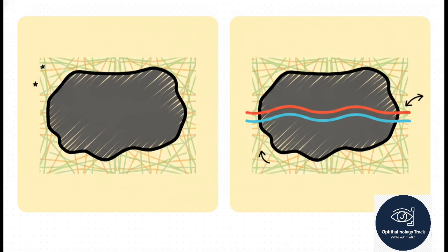Now, what's really interesting about this is how we can use blocked fluorescence to ground a flat 2D image into 3D anatomy. Take a pre-retinal hemorrhage. It sits directly in front of the retina, often taking on a boat shape. Because it's in the very front, it completely blocks your view of both the retinal vessels and the underlying choroid. It's basically a total blackout.